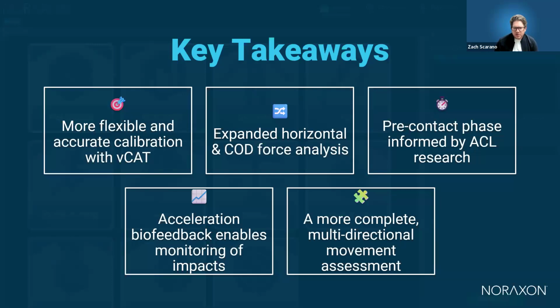And using these tools that are fully integrated into your existing MR4 workflows, hopefully will allow you to take advantage of them and find great use cases for them. And of course, as always, continue to deliver feedback to us so that we can continue to make enhancements and improvements across the board for these features and all of the other things that are embedded inside of the MR software.